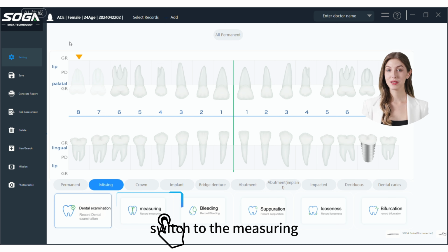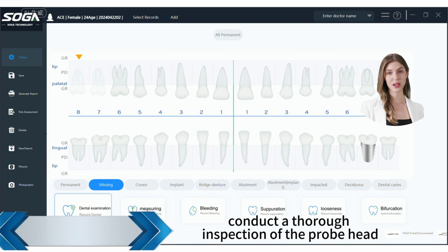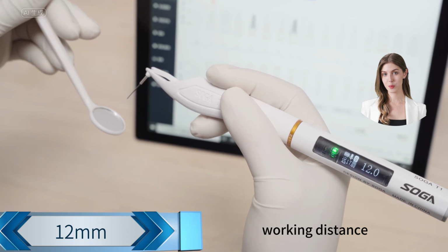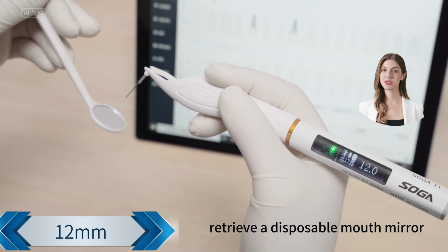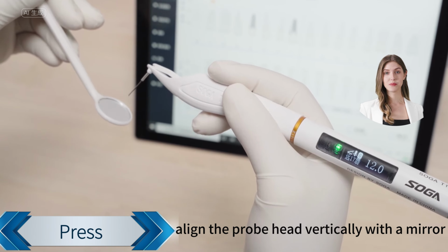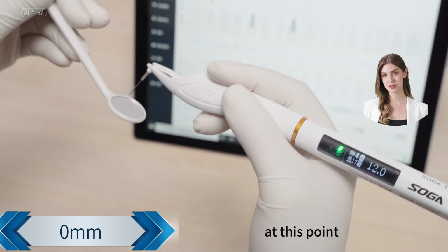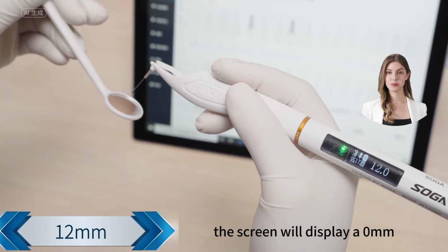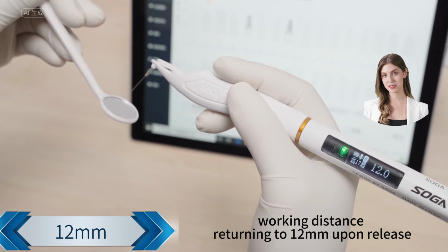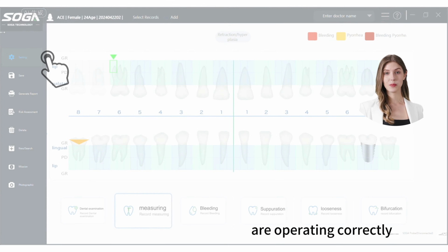Switch to the measuring. Upon handle activation, conduct a thorough inspection of the probe head. The handle screen currently indicates a 12 mm working distance. Retrieve a disposable mouth mirror from the clinical setting. Align the probe head vertically with the mirror, and apply downward pressure. At this point, the screen will display a 0 mm working distance, returning to 12 mm upon release. This confirms that both the probe head and handle are operating correctly.